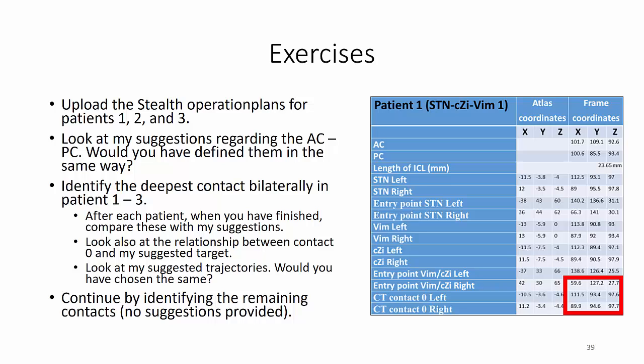Look also at the relationship between contact 0 and my suggested target. Look at my suggested trajectories. Would you have chosen the same? Then continue by identifying the remaining contacts in these patients.